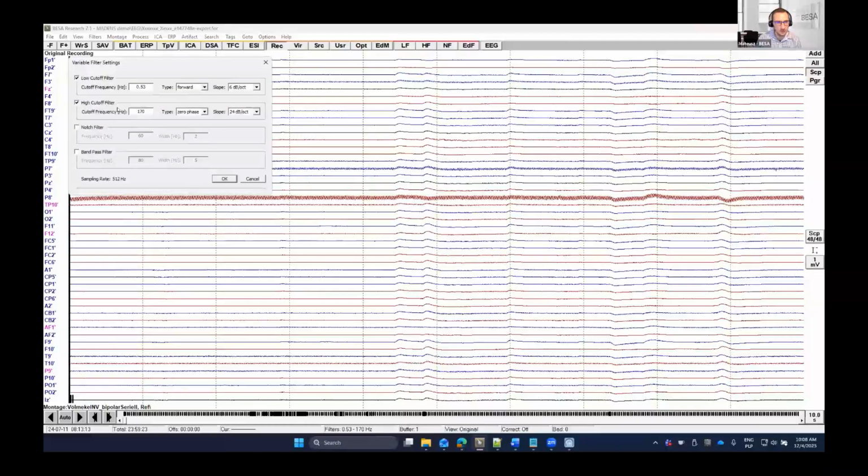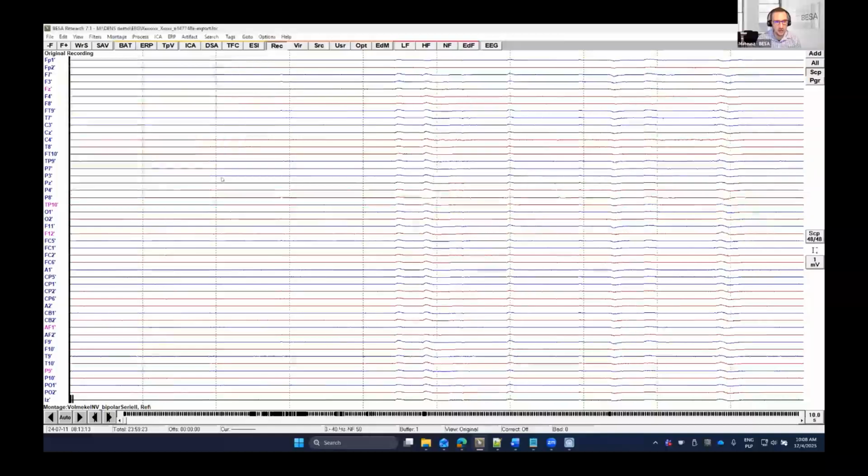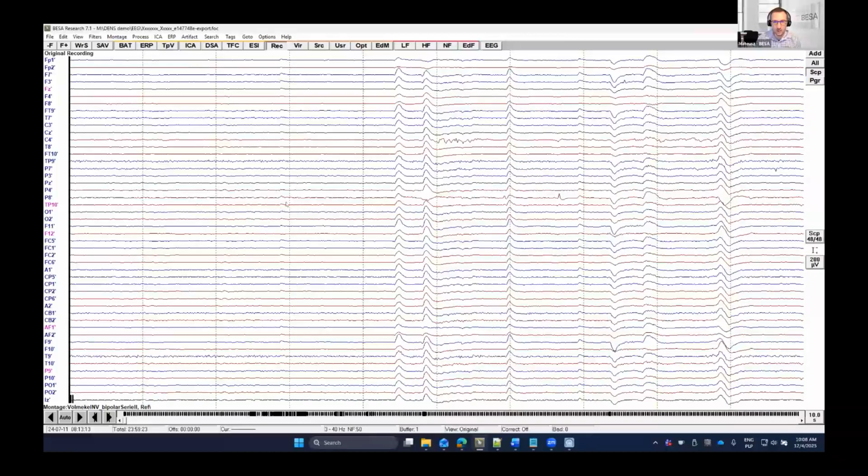filtration. When we apply the filtration, we need to apply some filtration. Let's say we'll go up to 40 Hertz, and we apply the notch filter on this data set. We start from 3 Hertz. And yes, this P8 looks good. But let's do the final verification.